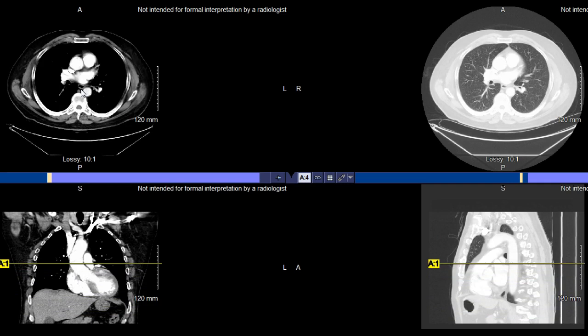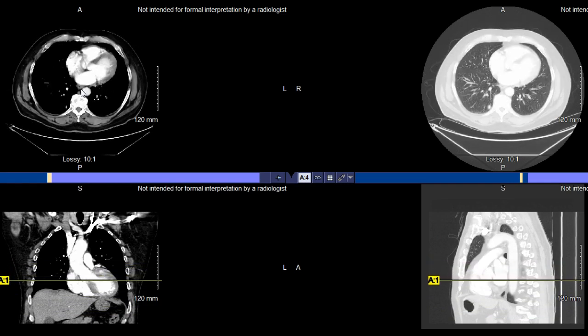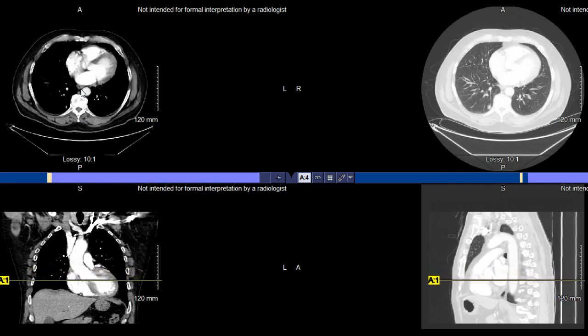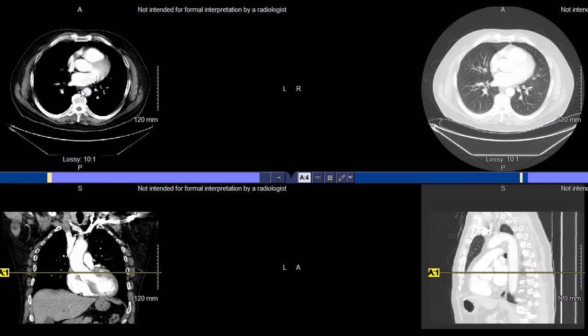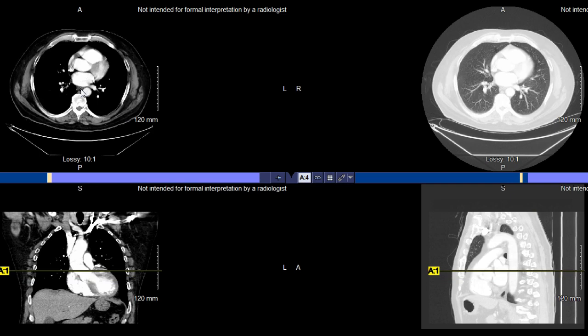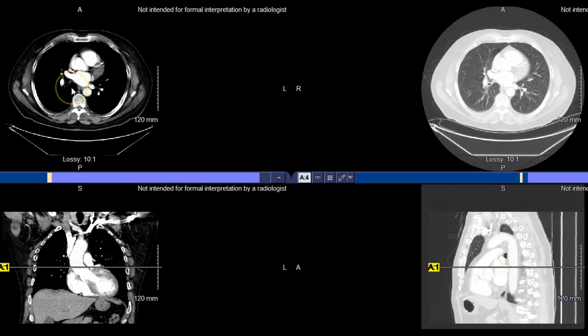So other heart-based structures, before we truly move on, I'm going to give you a nice picture of the four cavities here. As nice as I can get for this data set. So none of these slices are like, oh wow, this is so awesome, but this one's not bad. So in the center we have the ascending aorta, we have the descending aorta back here, but we can see the cavities relatively well here at the point of the right atrium, the left atrium, the right ventricle, and here is the left ventricle respectively. So pretty nice image here of those structures.